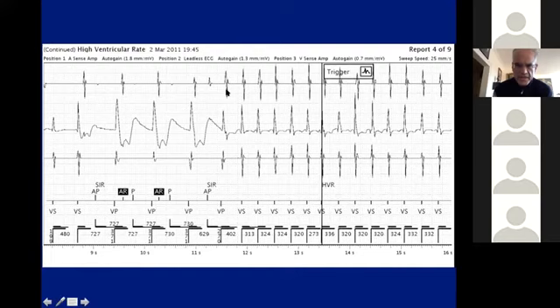So this is an A event that is superimposed on a ventricular paced event. So it is likely that this A pacing stimulus triggered A tachycardia, going fast, conducting one-to-one, and resulting in this rapid rhythm.